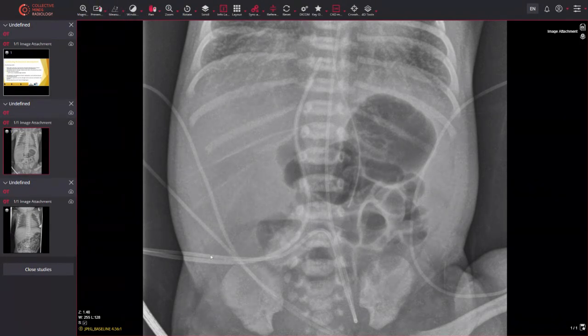We've got a UVC coming in here, so it goes again into the umbilical vein and then in a cranial direction up, with the tip now in optimum position. So this is at the junction between the IVC and right atrium, at hemidiaphragm level. This is a great position there. No gas this time in the portal venous system.